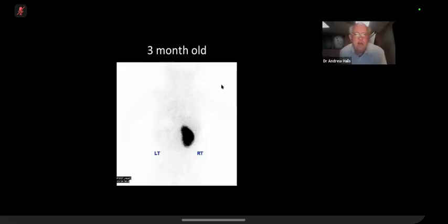Right. So I will actually ask you a question. I'm trying to hurry on time. Ask you about this one. So what does this show? I've got that image and I've got that image.